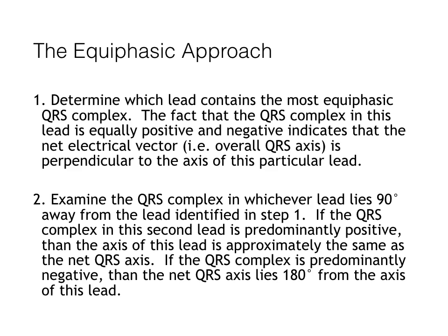The equiphasic approach is a little bit complicated for finding the axis, so we will discuss it later.